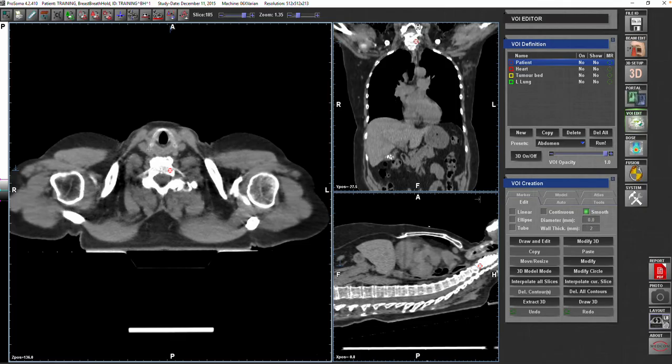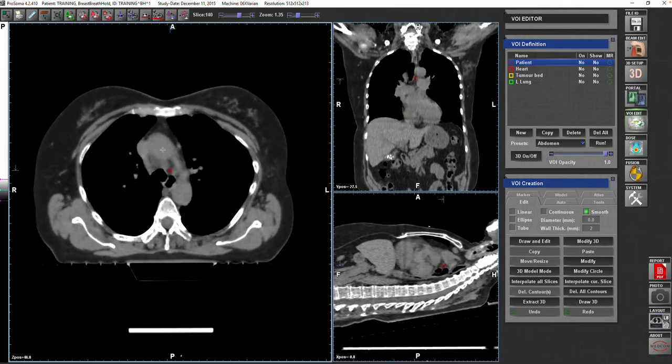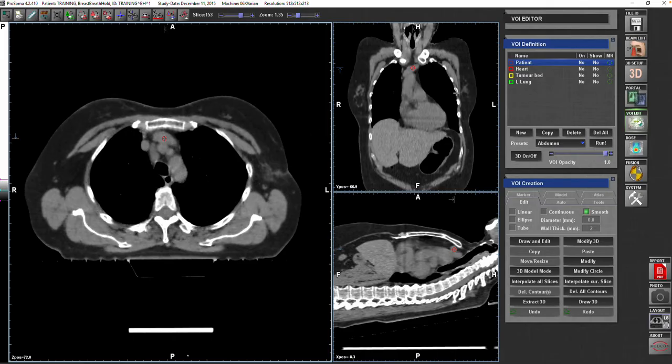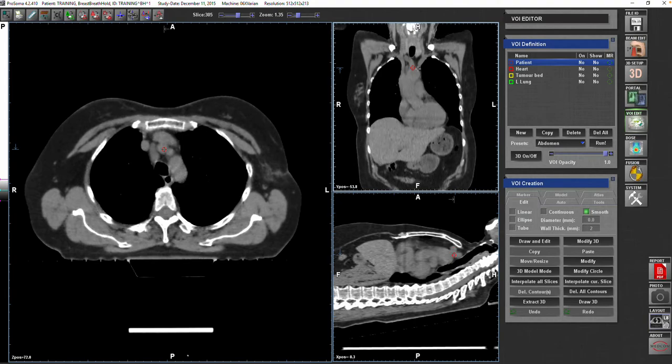The second landmark, as I just mentioned, is the subclavian vein. The subclavian vein is more anterior, as you can see here, and it will appear in the most anterior part of the coronal view, so you cannot be very anterior like that and then imagine that this arch is a subclavian artery. So the subclavian vein is different from the subclavian artery in being very anterior.